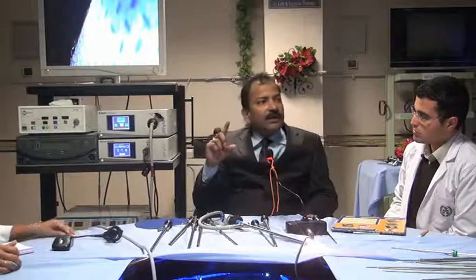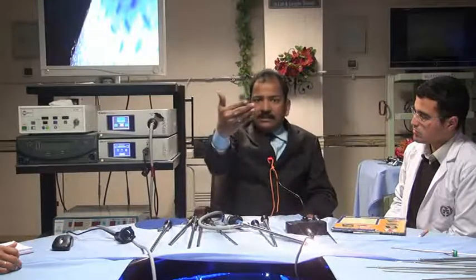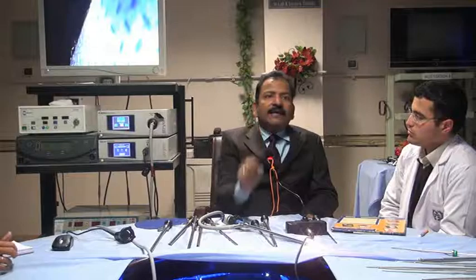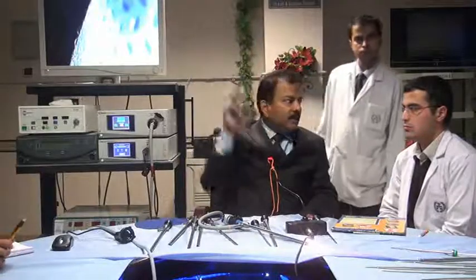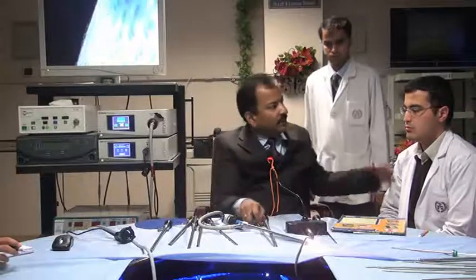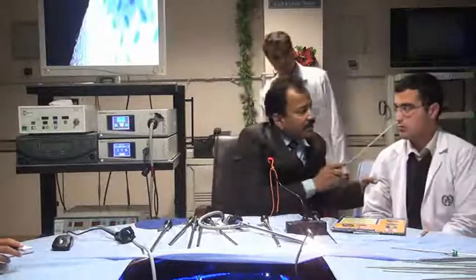If you use the flash of your camera, you will not see the shadow, because light is coming on the same axis and the image is reflecting on the same axis. So the camera cannot see. That's why artistic photographers don't use flashlight. They use light from another source. Like right now I will show you, in his face you see the shadow here.